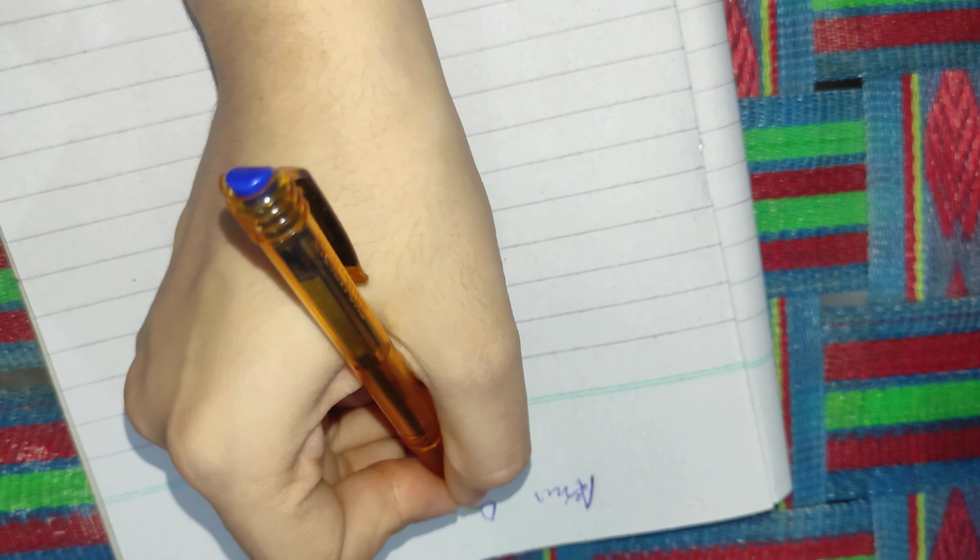In this video I will try to teach you guys about axis deviation in ECG. First of all we have to remember two things. The most important two things for axis deviation are lead 1 and AVF. We will look at these two leads. Now if we see in ECG how they are put, this is lead 1 which is positive, this is AVF which is again positive, and this is negative, and this is basically the axis deviation. We have to keep this in mind.